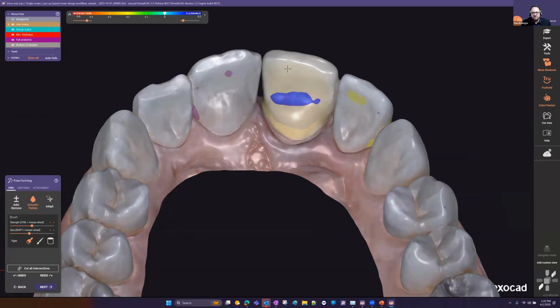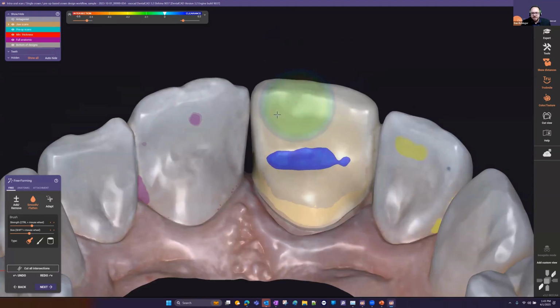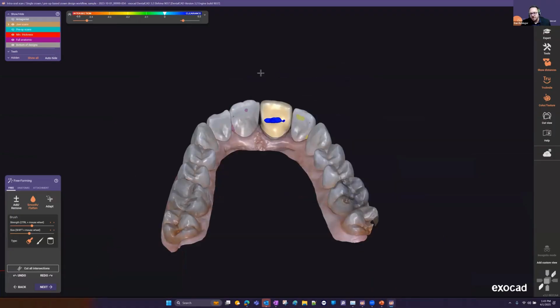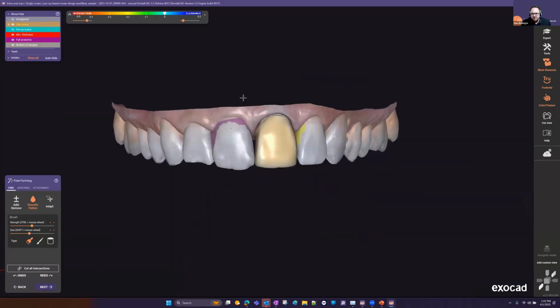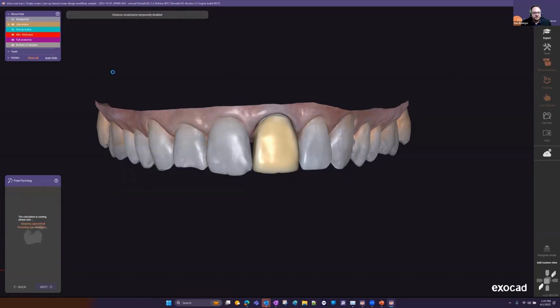When you hold shift, when the smooth and flatten tool is enabled, that's bringing you into the flatten object. So when it comes to, let me turn off that pre-op, you will dramatically change the shape of the object you're working on. And like I said, it comes in handy a lot, especially when you're working on those bridges. So just as we go through the different cases, I'll cover other tools, but that's something I definitely want to make sure everybody's aware of.